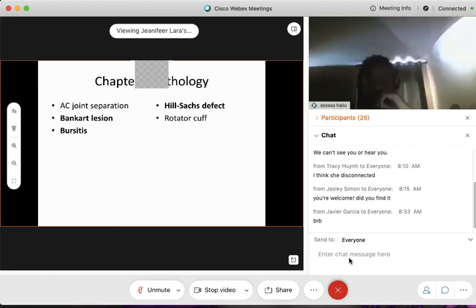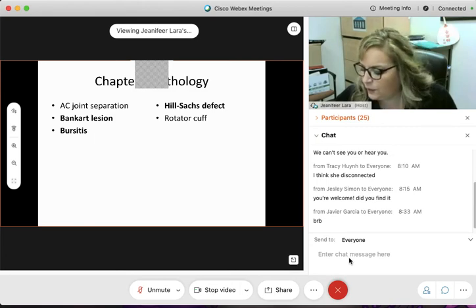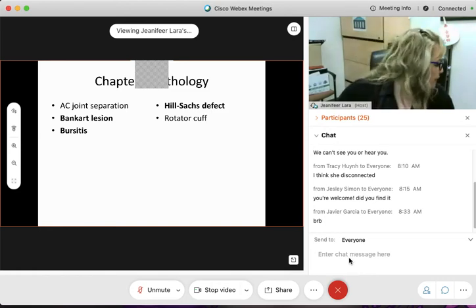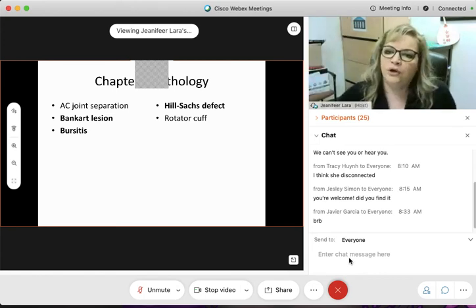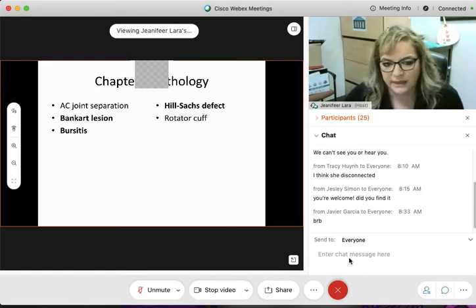It's a fracture. Just a fracture? It's a compression fracture. A compression fracture of the humerus. Okay. I'm not 100% sure about the Grashey method, but I know that you can see it in the Stryker notch method with the external rotation, the inferior superior, that you are able to see the Hill-Sachs defect. But I will double check with the Grashey method being part of the Hill-Sachs defect.